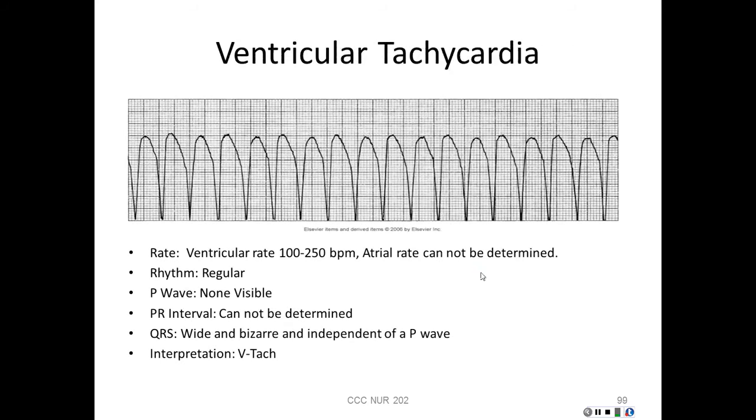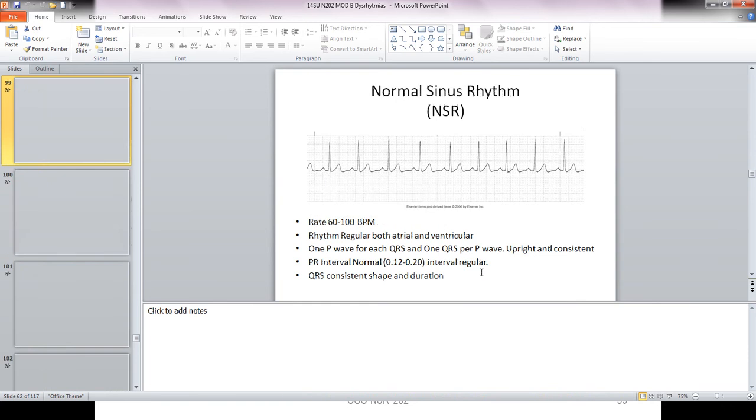Next thing we're going to look at is called ventricular tachycardia. Ventricular tachycardia. Now, as you look at this, it looks like it's just a number of PVCs hooked together. And really, that's what it is.